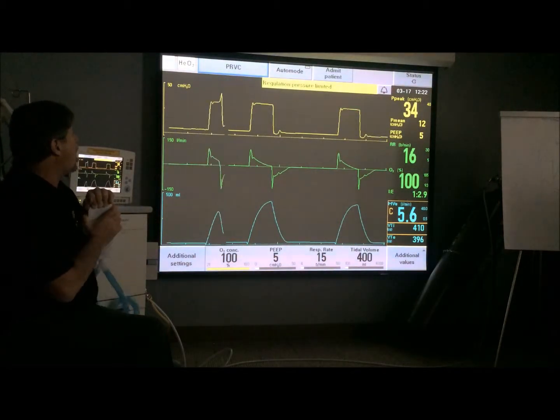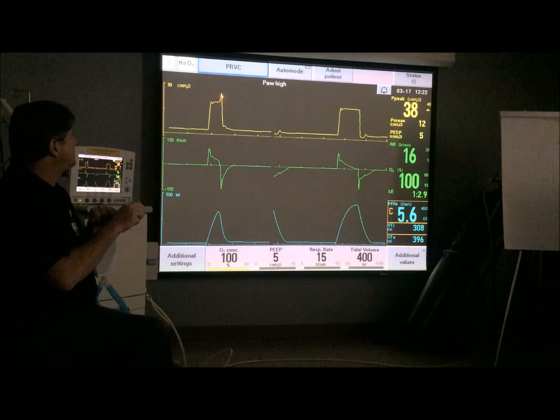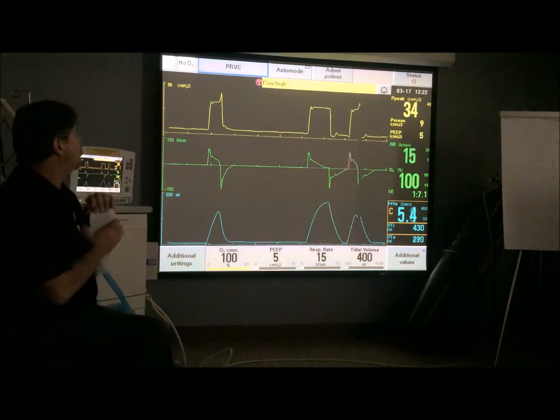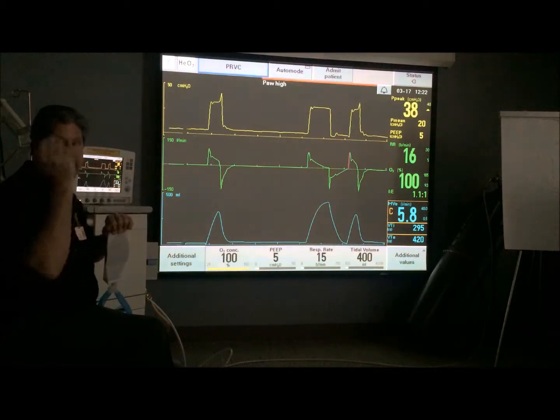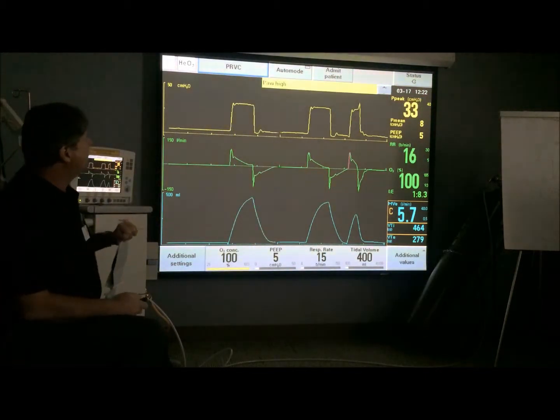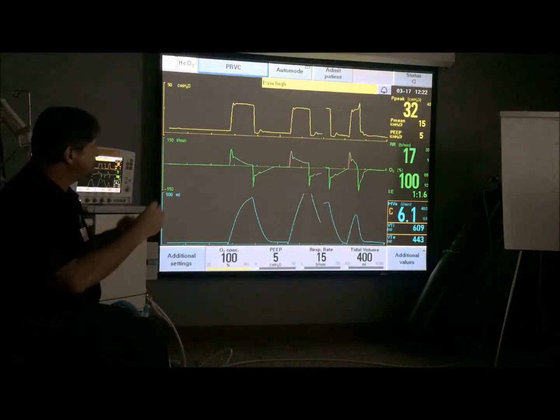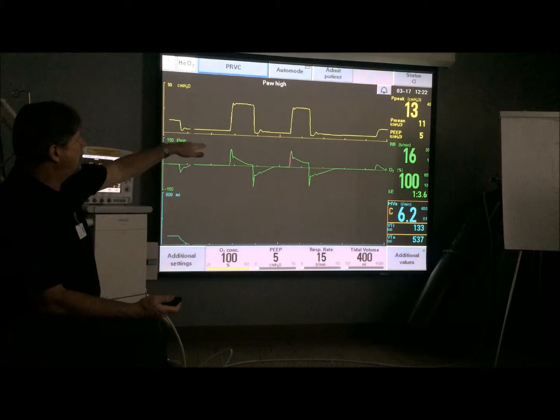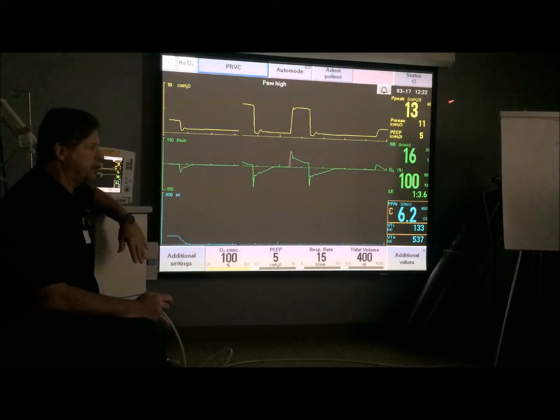If the patient coughed, it would look like this because he is hitting his upper pressure limit at 40. And you can see that it's red and the ventilator's popping off, not delivering nearly the tidal volume that you want. But as the PRVC, as you get these incremental changes in pressure, the pressure won't go any higher than 5 centimeters below that.